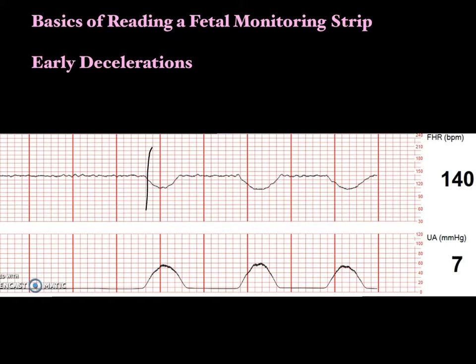They mirror the contraction exactly. So the beginning of the decel, sorry for my finger being so wobbly, they are like an exact mirror image. They start when the contraction starts, they end when the contraction ends, they get to their lowest point when the contraction is at its greatest point. And the reason for this is head compression. It's a vagal response to the head being squeezed.